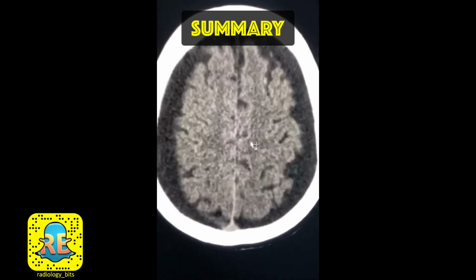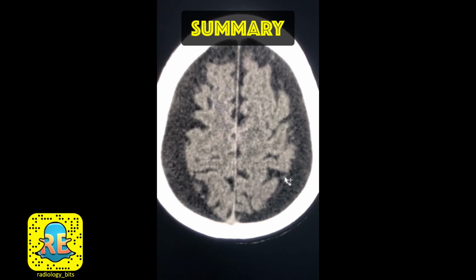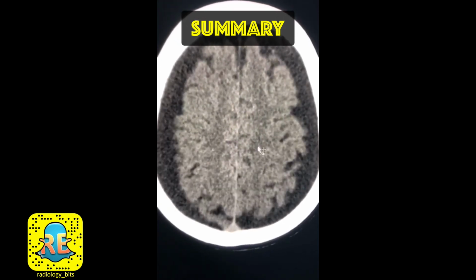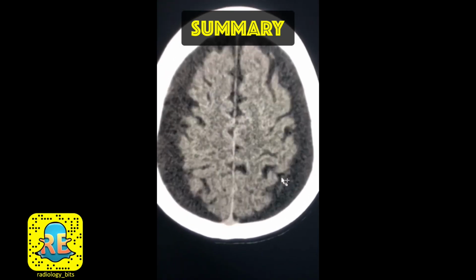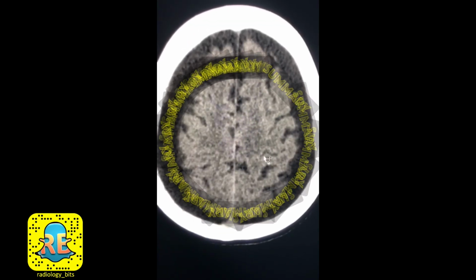Finally, one of the things that you could look for is actually displacement of the vessels inwards to help you decide if you have a collection, whether it's hematoma or not, in the subdural space. That's of course easily seen if you give contrast, but you could see it without contrast as well, such as what we see in this case.